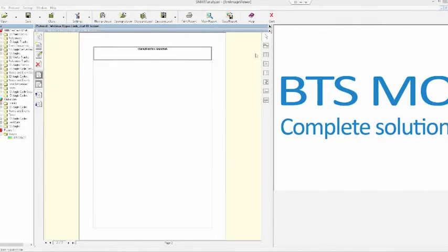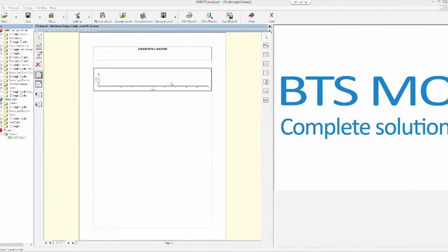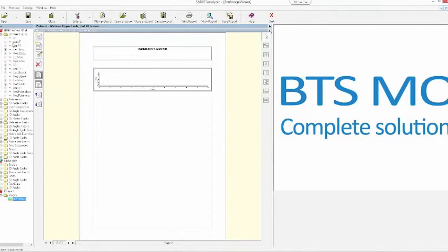To create a graph, we have 2 options available. The first is for designing a plot, and the second is for designing a cyclogram. Let's start with the plot. So I can click on here, and I need to draw a rectangle. Okay. To add a graph in the data panel, we have to choose the variable that we want to show. For example, I want to choose a 3D trajectory that is below this menu.